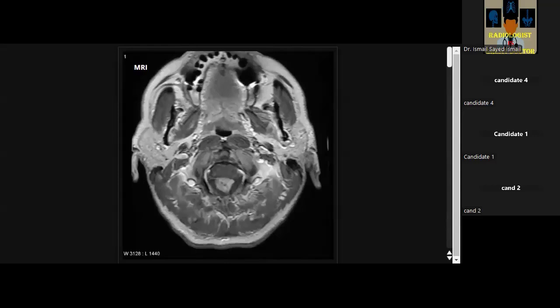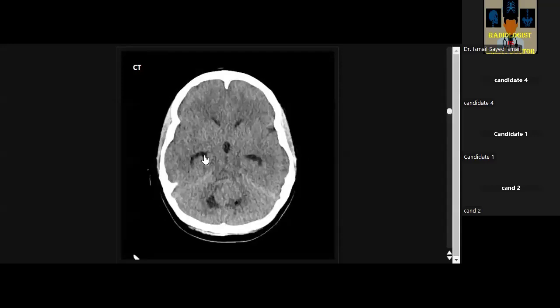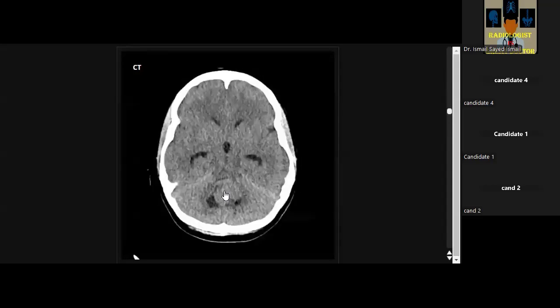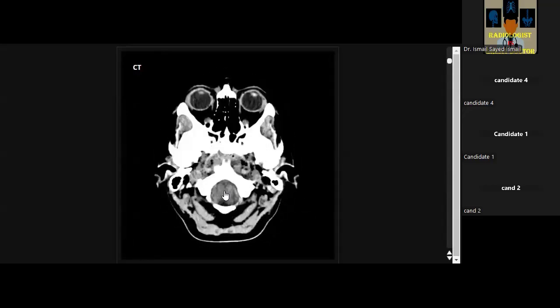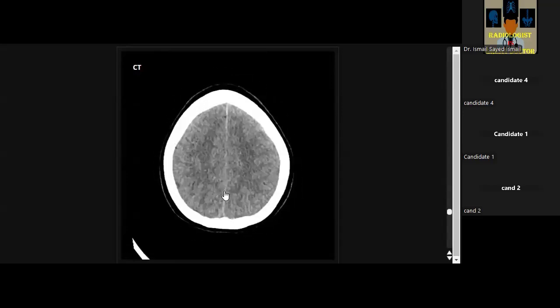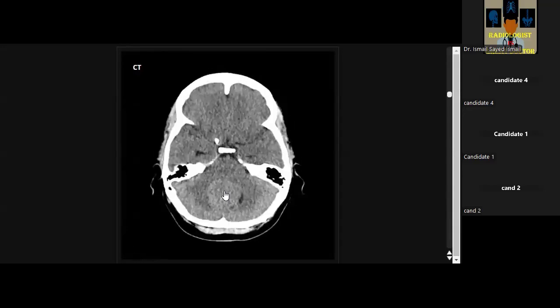Very good. Okay, I will answer now, so you can leave the mouse. Starting with a posterior fossa lesion, a midline space occupying lesion centered on the fourth ventricle, causing obstruction or effacement of the fourth ventricle with supratentorial hydrocephalus. Usually, if you start scrolling with the examiner, scroll till the end of this study, then come back to the main pathology and start to describe it.